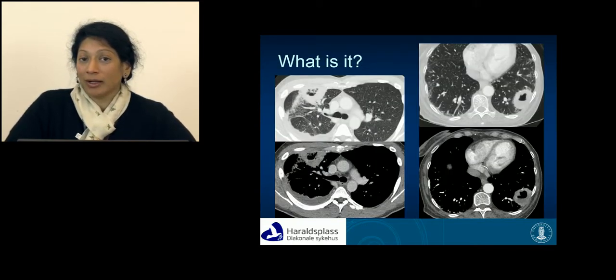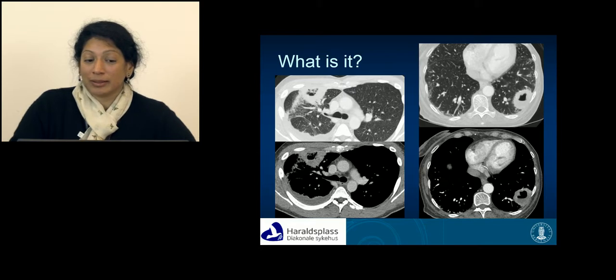So in our clinical practice, we have cases when we meet this, and these two look relatively similar. One of them is a cancer, one of them is an infection. We have a cavity with a thick wall, some contents. Again here, cavity with a thick wall and some contents. So what is it? Which one is the abscess and which one is the tumor?